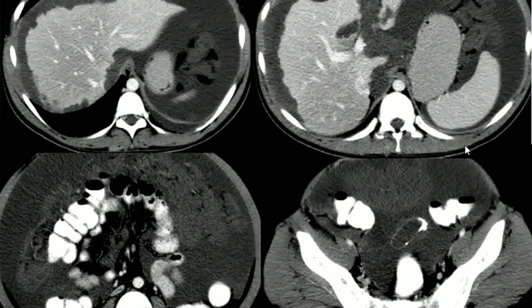just anterior to the sigmoid. Could be a part of gut, but I cannot see clear margins. However, the abdominal muscles as well as the visualized bones are normal, and the left kidney is visualized, which is normal. As the collection is slightly dense, the liver is irregular.